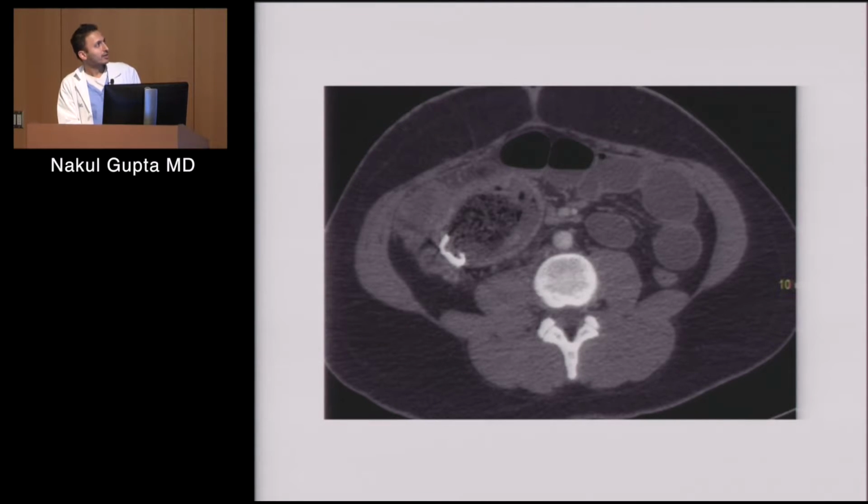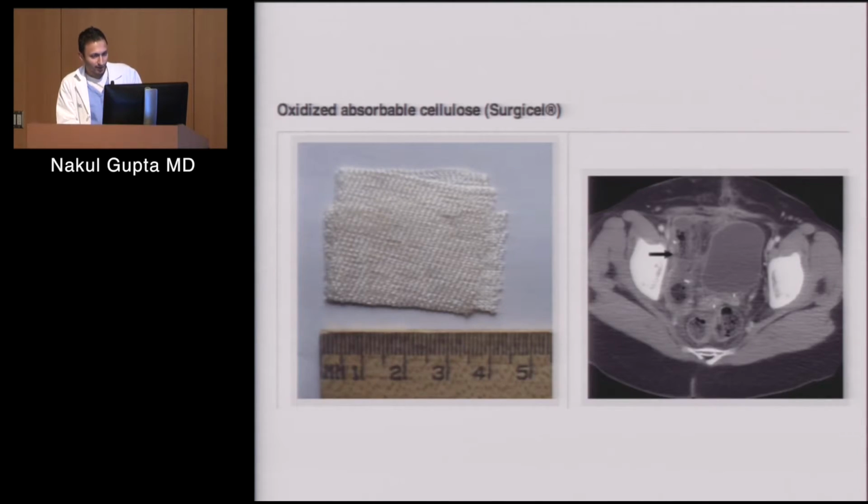Now, one thing, sometimes if these are left behind, people will develop an abscess around it. Their body will wall it off and form an abscess, and that's called a gossypiboma. That's probably what this is here. Look, the body has built a wall around it and contained it. So, gossypiboma. All right, on to some other stuff now.